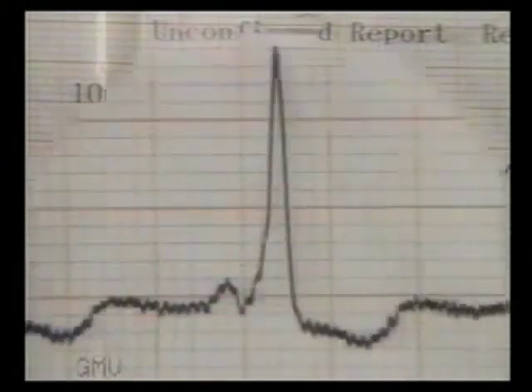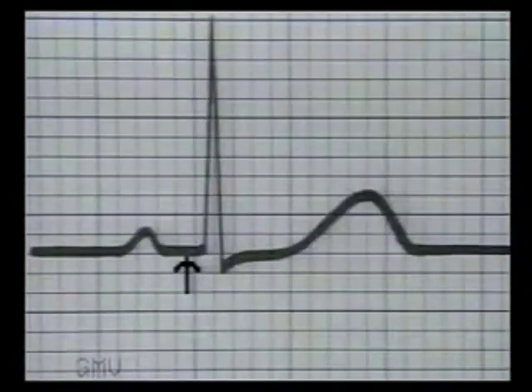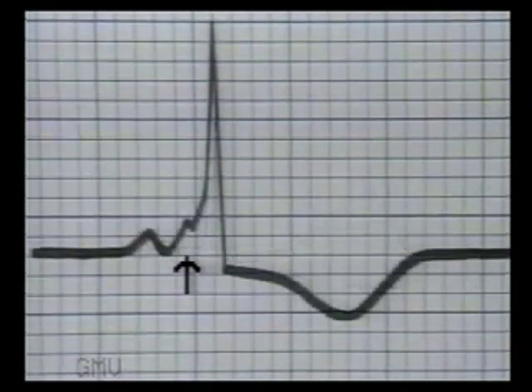It is important to know the presence of WPW syndrome, as it often leads to serious tachyarrhythmias in later life. The isoelectric line between the P wave and the QRS complex is due to the AV nodal delay. But in WPW syndrome, the impulse leaks to the ventricles via an accessory bundle of fibers called the bundle of Kent. So the isoelectric line between the P wave and the QRS complex is replaced by a slurred upstroke.